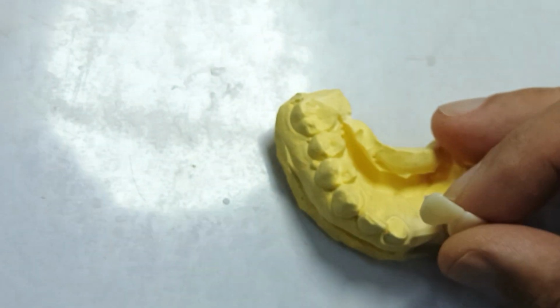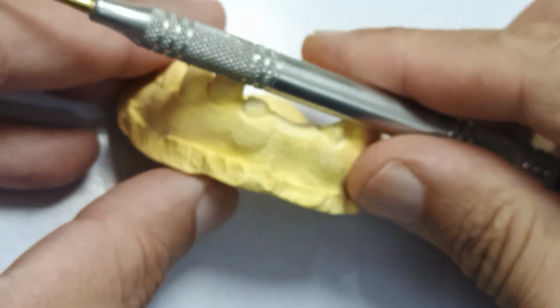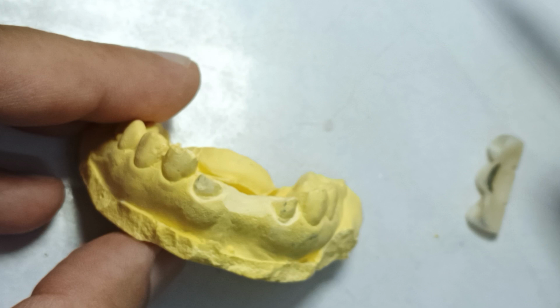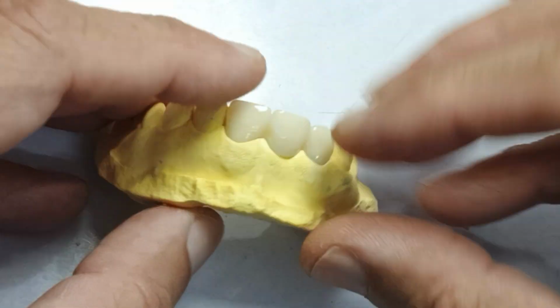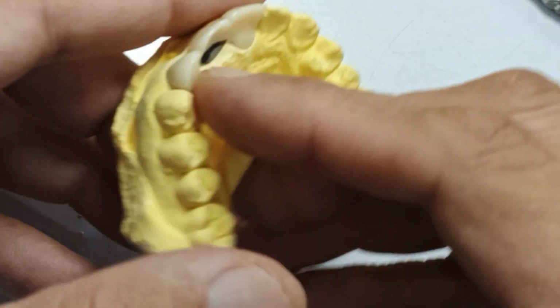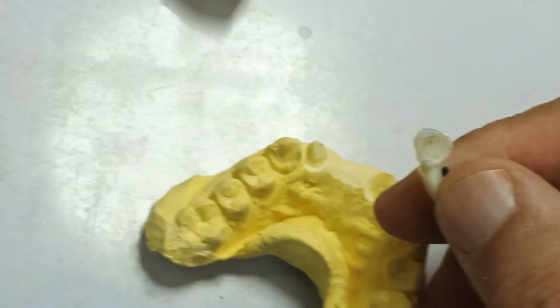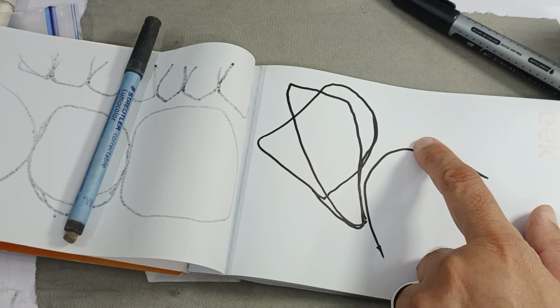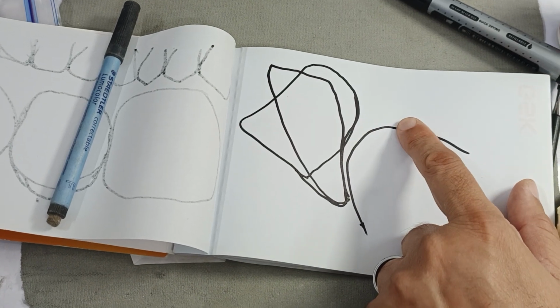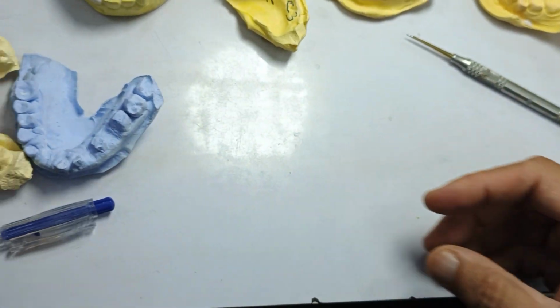Now here's another example. Same thing with the bridge. Overcutting. This is the same one, and look, the bridge is ridge lapped. This black part should not even be there. The bridge design has to be like the ridge right there. This is the buccal. Ridge lap should not be there. It should not be covering the lingual aspect of it. Bring it back, please. So let's put this aside.